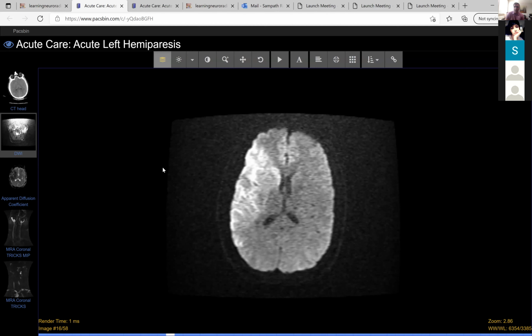If it's a severe deficit, then you have to say that, well, I don't see anything at this point, but it doesn't mean the patient doesn't have something going on, because CT does not pick those things up in the very early phase of a stroke. So in this case, they have to go to the next level, which is to do an MRI, where they can see the stroke manifest quite well.